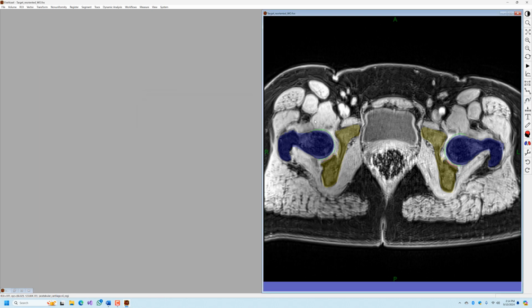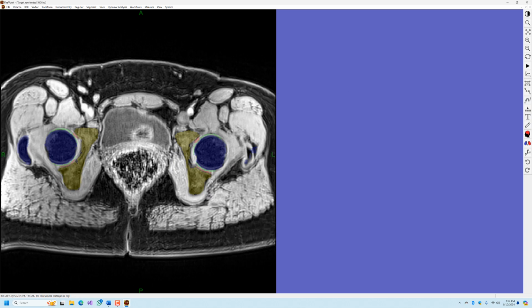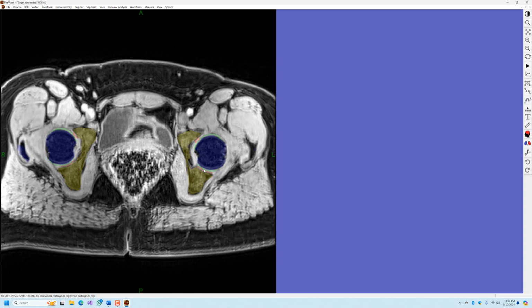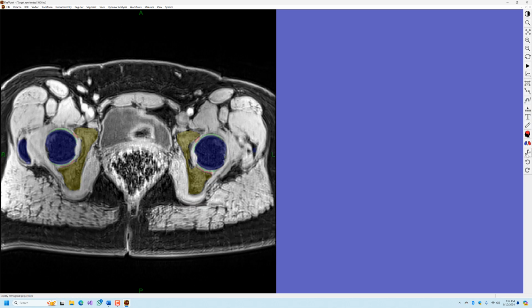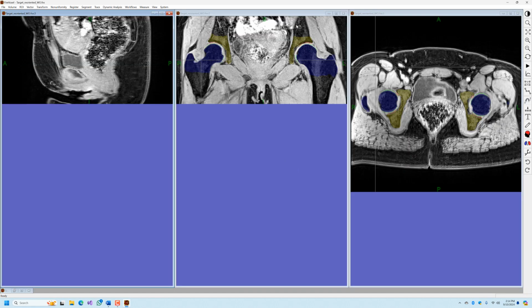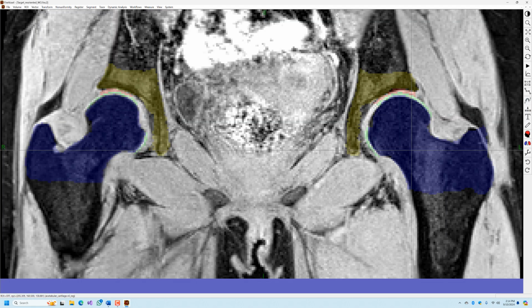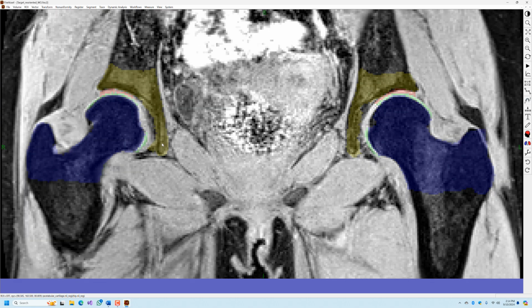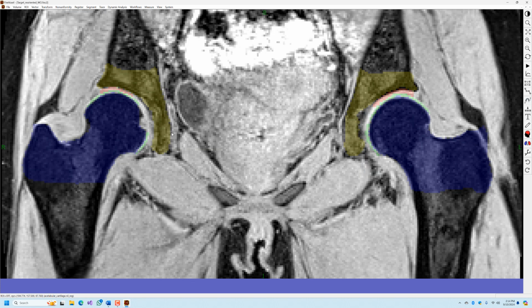the anatomical structures from the atlas, are now overlaid on top of the target image, and we could see that the alignment is quite good. If you press this item on the right on the toolbar, you could see it in 3 projections, and note that the cursor is synchronized, so you could see alignment in various projections.